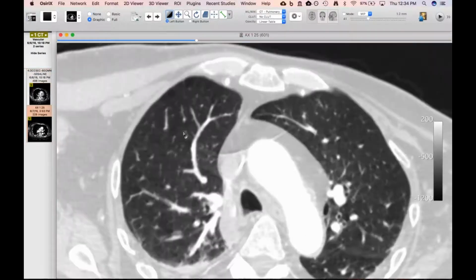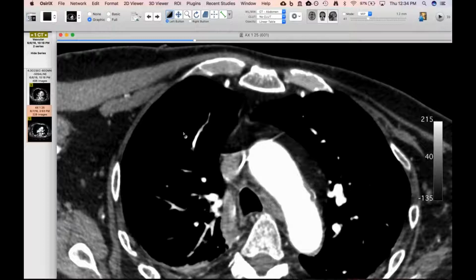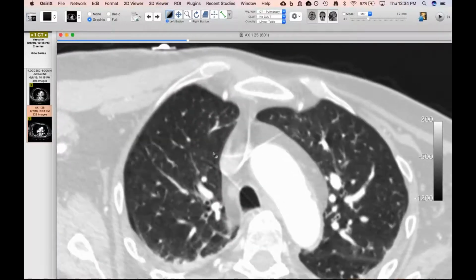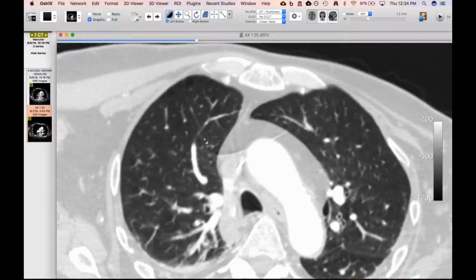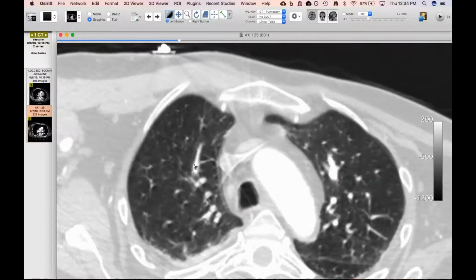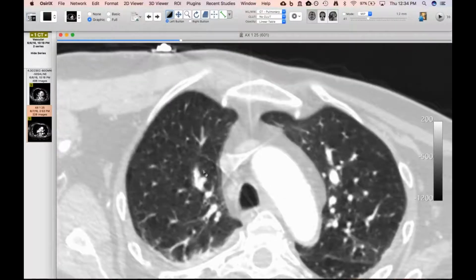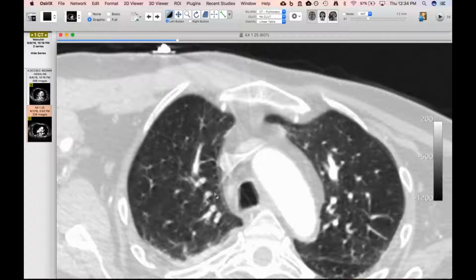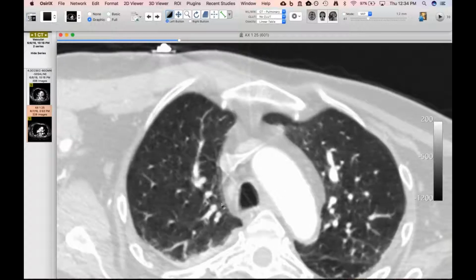And then of course they repeated this the next day, and now you can see there's no question that there's nothing actually in that airway or in that artery. It was all just air. So just the idea, underscoring, it's right here actually, this one, because you can see that airway next to it again, and then just reinforcing this idea that you should not see two of the same structure paralleling each other in the lung.